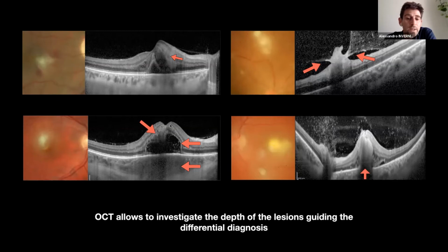while in the bottom left corner, we see that we've got a bacillary detachment, we've got retinitis, we've got fluid, and we also have focal choroidal thickening with disruption of the choroid underneath the retinal lesion.